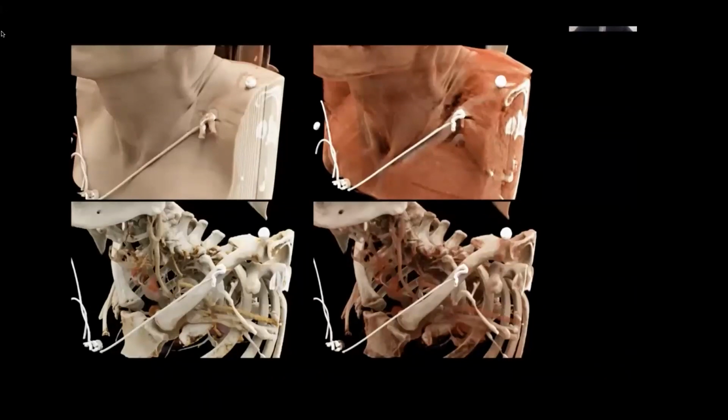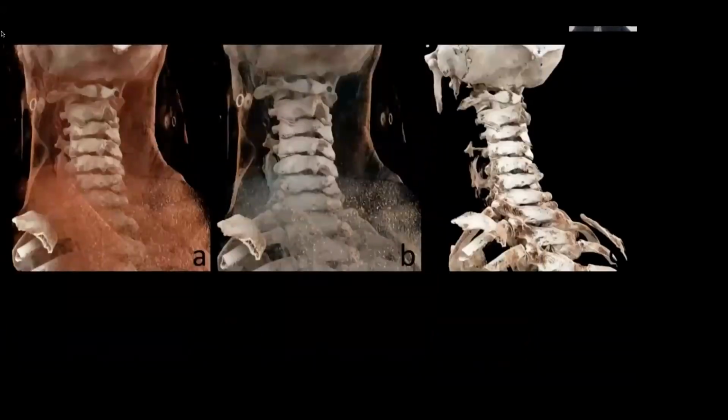You could. So for example, if you were considering whether or not there's a small vessel coursing close to a tumor or something like that, you could filter that in or filter that out depending on the algorithm. And I think that's where a mistake could come in, not being aware of the fact that something is being filtered in a certain way. But I think overall the technology is reliable.